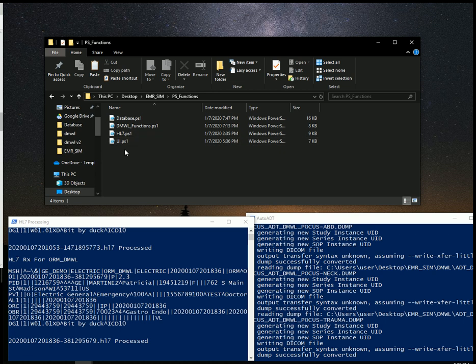And then I've got some functions in here. All the stuff that's my simple little poor man's database is in this database folder, and then DICOM Modality Worklist functions, HL7, and then anything for the UI. So DICOM Modality Worklist, HL7 stuff, the database, and then the user interface.